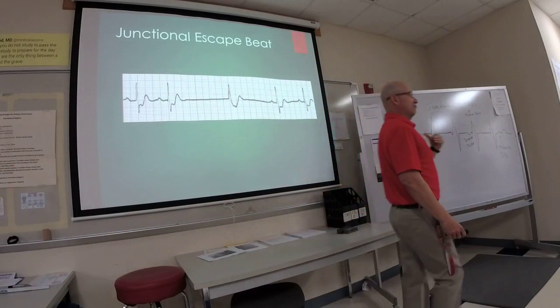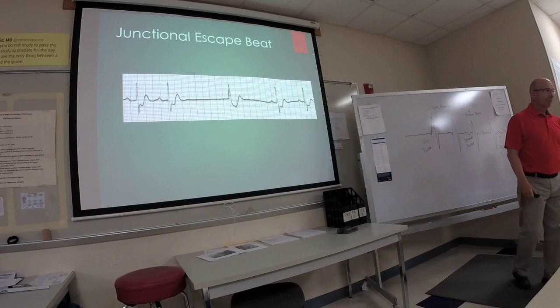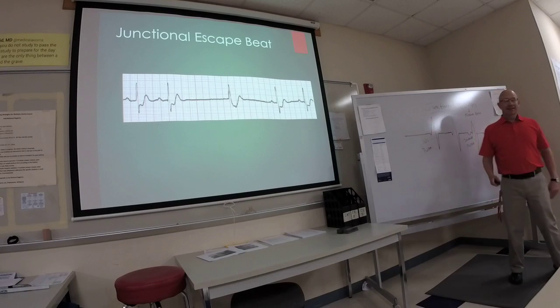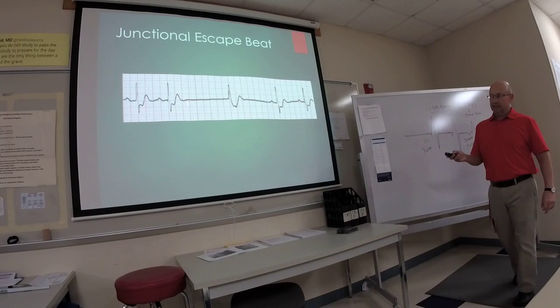Now, at first glance on the PCT side, normal or abnormal? It's abnormal. But what would you do? Tell the nurse. Freak out, then go tell the nurse. Let her freak out or him freak out. So you report that to the nurse. That's a problem. The underlying rhythm is what? Sinus. So the underlying rhythm is still sinus.